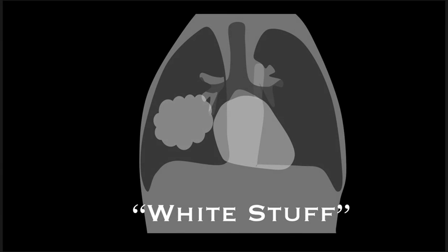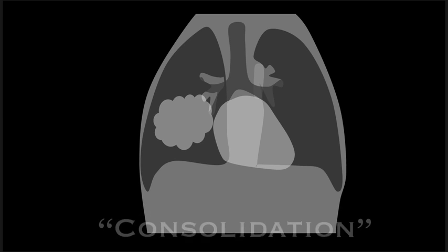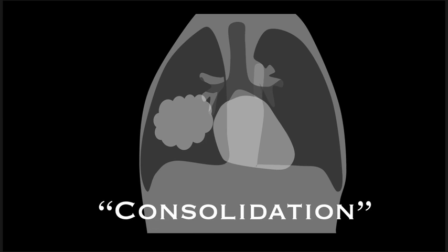So the last thing that I want to talk about was something that I mentioned very early on in our first case, where I showed the pneumonia that sort of looked like a cancer. And I want to bring up this vocabulary word here, consolidation. When you see white stuff on a chest x-ray, sometimes you get the strong urge to give it a name.